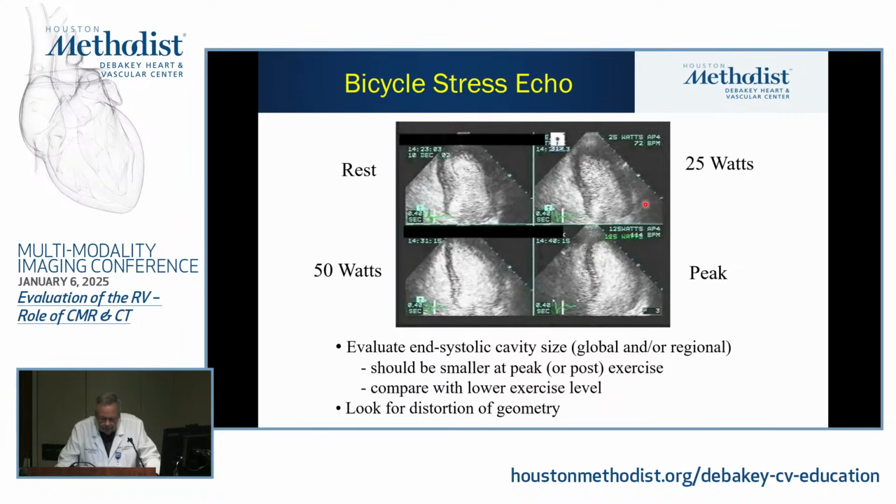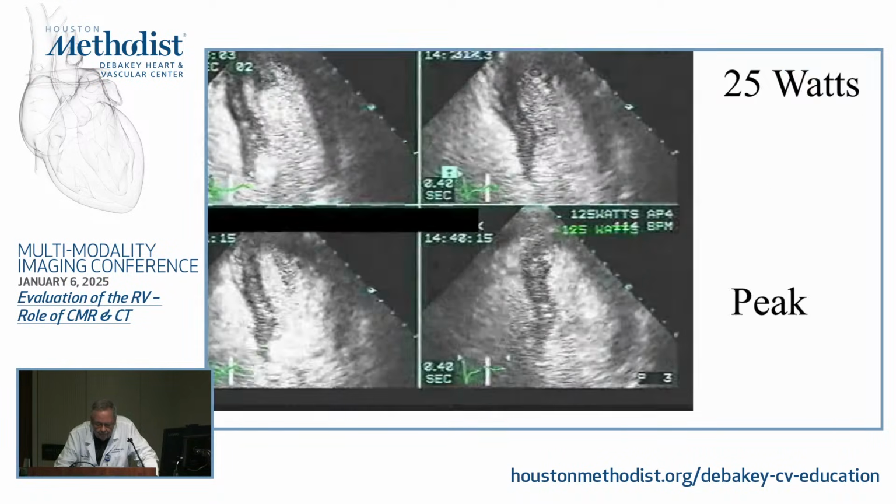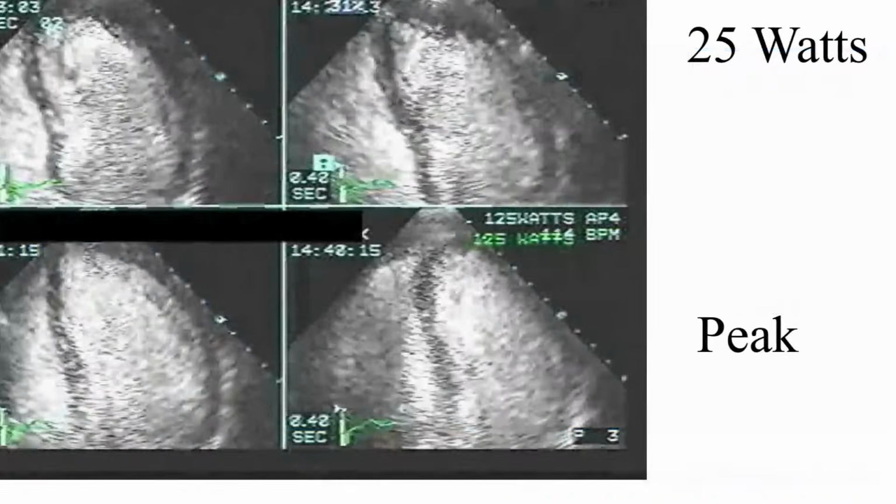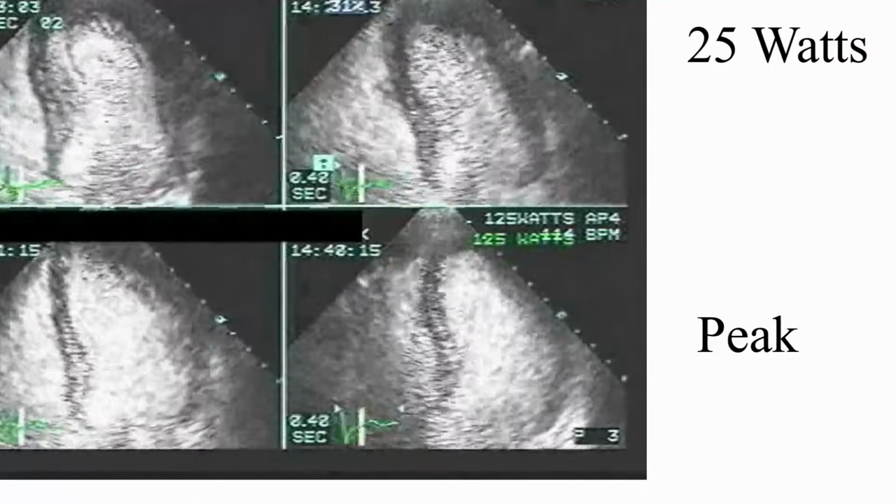So let me see if I can play some tricks here. Okay, it worked. So look again here, and look at this area right here, the regional size right here. And look at here.